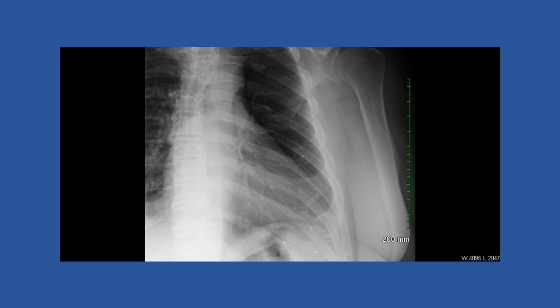The radiologists are really good at seeing rib fractures, whereas most of the rest of us don't see them anywhere near as well. So here's another view that you see, and I think in this case right here, there may be a little bit of a displacement there, but again, I'd wait to see what the radiologist had to say.